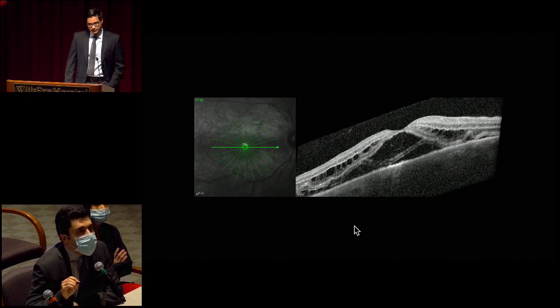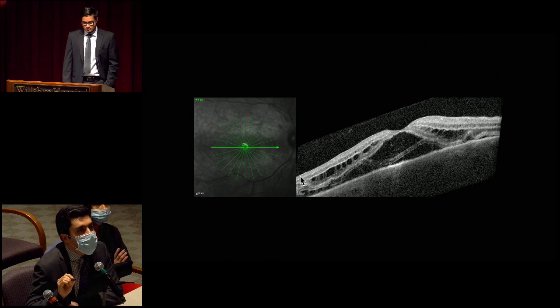We have an OCT. So we have a horizontal OCT going through the right fovea here. Looking at the infrared image itself, the retina seems to have this somewhat wavy, undulated appearance, and if we correspond it to the B scan, it seems to correspond to these somewhat outer retinal folds, perhaps, that we see. A lot of disorganization of the retinal laminations here.